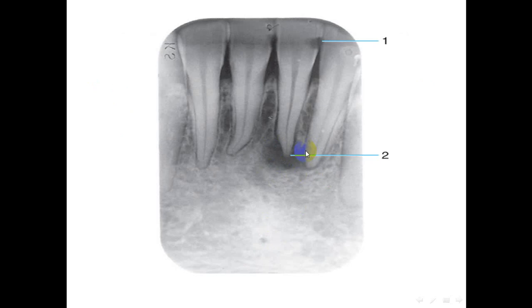So the caries on the distal side of the left central incisor makes a round radiolucent lesion that may be a periapical abscess, maybe a granuloma, or even a cyst. But if that radiolucent area becomes more than 2 centimeters, we can see that it is most likely a cystic lesion.